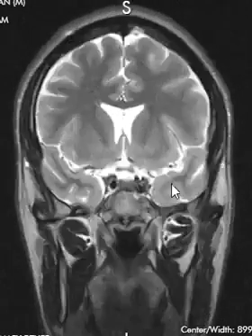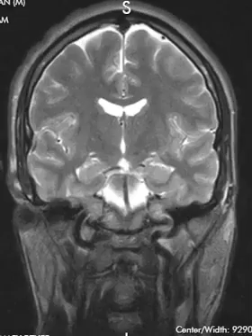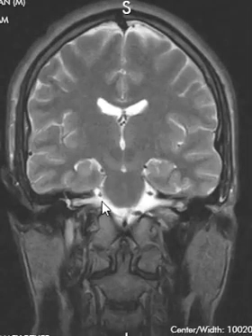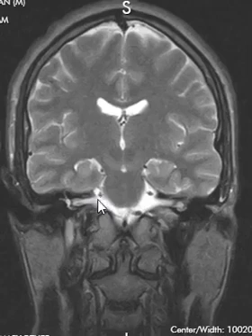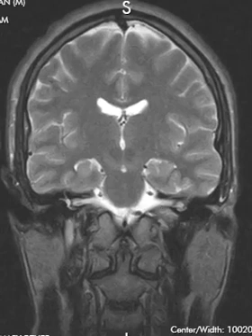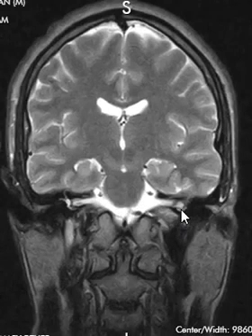If we continue on back here, we eventually get to the internal auditory canals again. Take another look at those. We see them coming across here. The 7th and 8th nerves go through there. We can see the semicircular canals going up. And also we can see the cochlea on the left-hand side here. And we have thin images. I don't have them on this patient, but we get really super thin images where we can see all the details very nicely and see the individual nerves going through here.